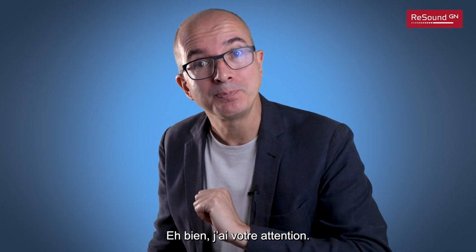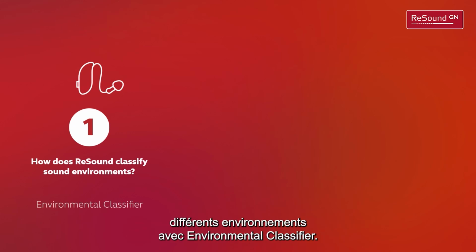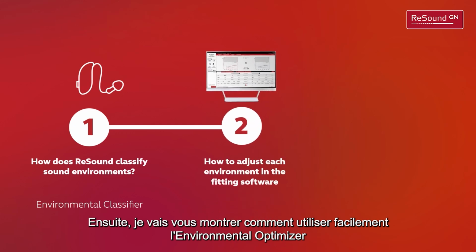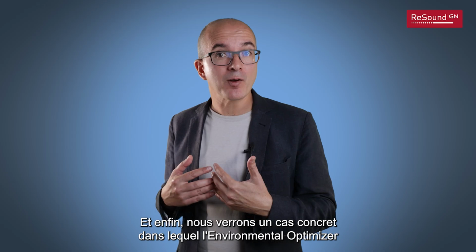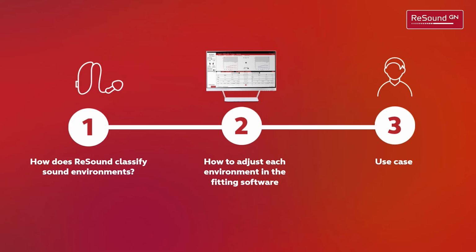Well, I got you. First, I'm going to show you how ReSound hearing aids can accurately classify different environments with the environmental classifier. Then, I will show you how you can easily use the Environmental Optimizer in the fitting software to adjust specific environments. And finally, we will see a real case where the Environmental Optimizer made my life so much easier. Ready?